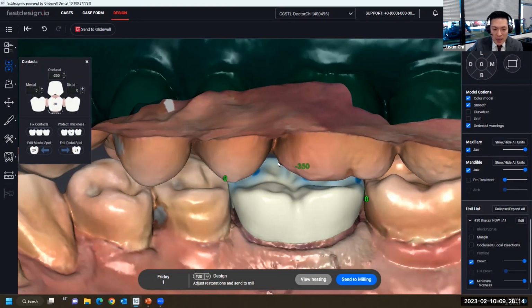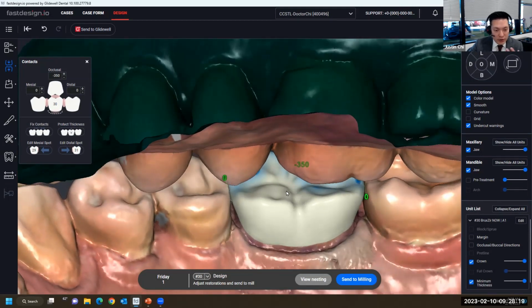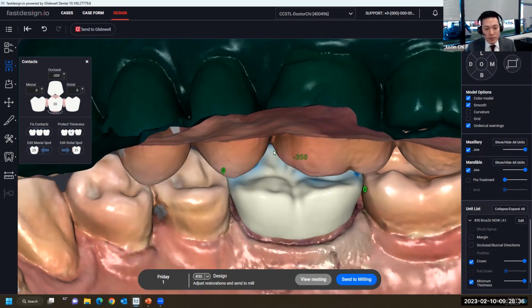There are different occlusal philosophies. With these mandibular molars, we often like to, or you may have heard of tripodized occlusion, where there are 3 points of contact around a functional cusp of the opposing, or 3 or more points around one of the cusps. And it is dependent on the position of the patient's teeth. This one's a little bit more straightforward.